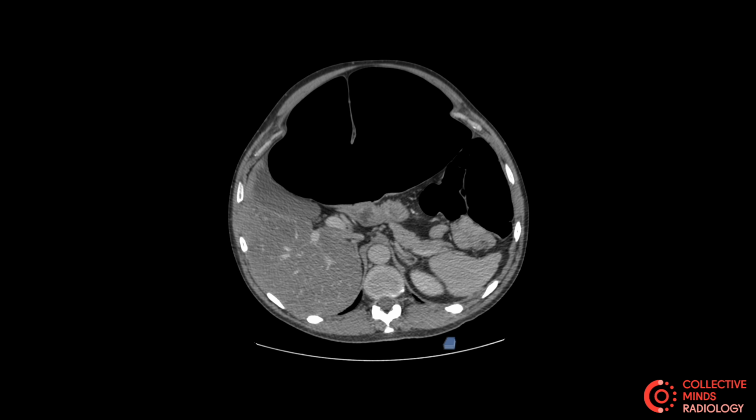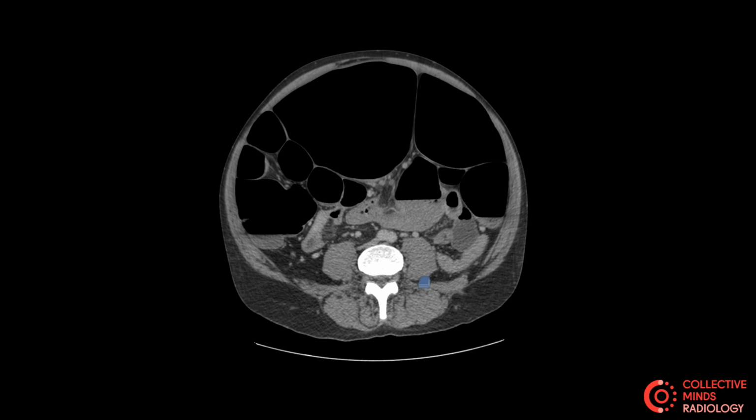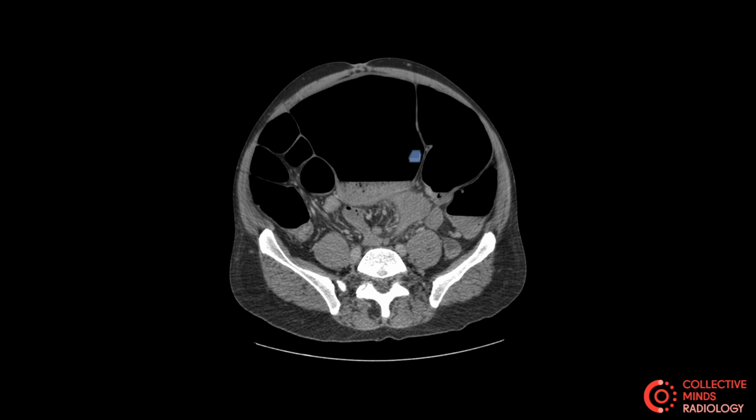It all looks completely normal. So we're gonna have to do what we did before. Follow the bowel. So you may have noticed that the bowel is this stuff over here. What's sitting inside the bowel? This is air. Air outside the body, air within the body. So this is air, and it looks like there's a lot of air inside this bowel, doesn't it?